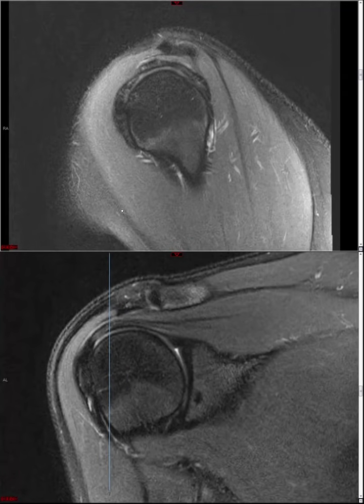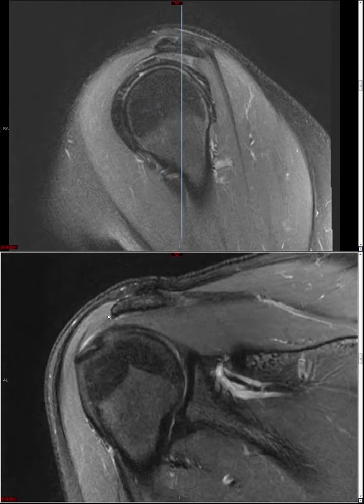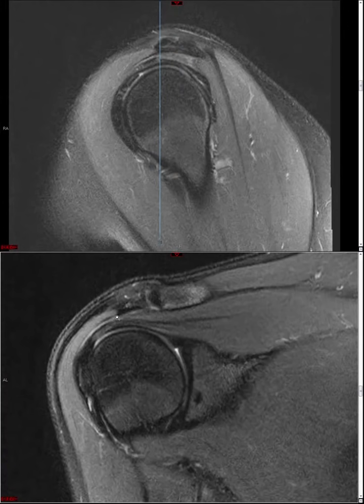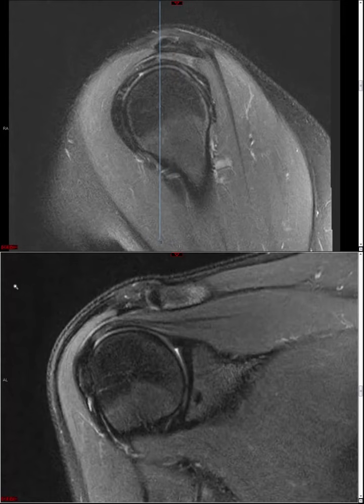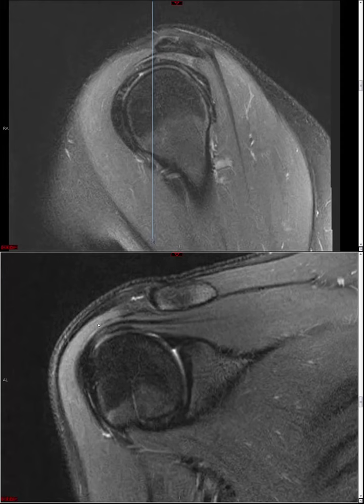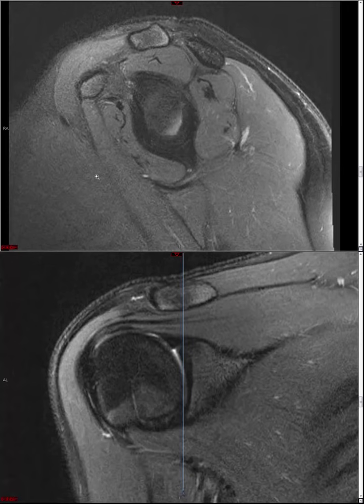Okay, so why else might you have a lot of fluid in the subacromial subdeltoid bursa? Well, it could simply be subacromial subdeltoid bursitis, either mechanical, or because of underlying inflammatory arthritis, or even underlying low-grade infection. Alternatively, maybe someone had just injected the shoulder, maybe a therapeutic injection, or maybe someone was trying to do an arthrogram and got into the bursa instead. Then you might also see a lot of fluid in the bursa. So usually it's fairly straightforward to sort out between all these possibilities.